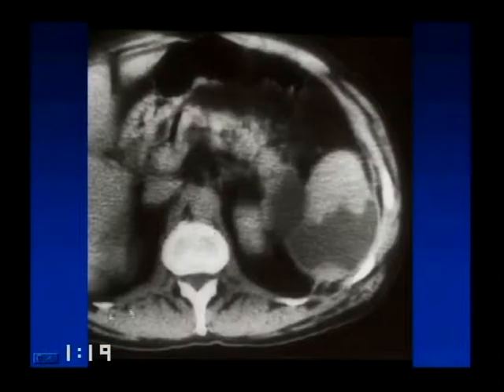So here's a hypodensity in the spleen. Notice the very sawtooth pattern of this documented and proven abscess, because at path, what happens is near the abscess, you get focal areas of infarction. So that accounts for these little wedge-shaped areas. And actually, you might hear people say that, well, the capsule of the spleen is a barrier to the extension of infection or tumor. That's not really true.